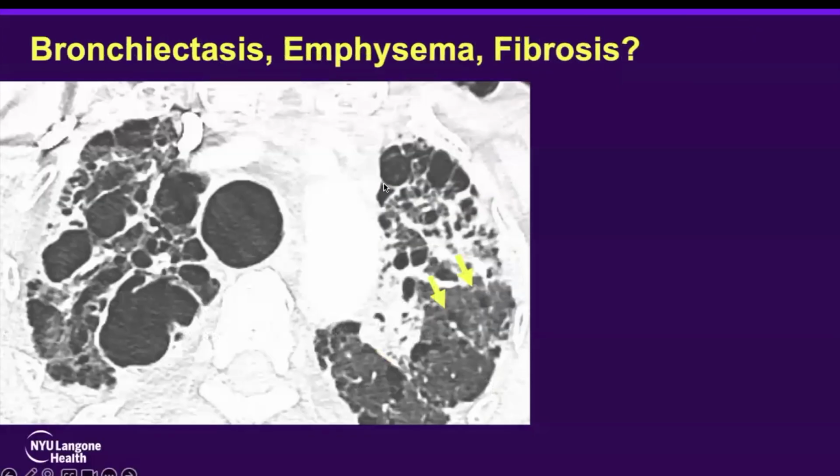Now, this case is encountered oftentimes when individuals show up acutely ill, and this patient lacked any prior imaging. Notice how there are large cystic abnormalities, and we need to consider whether this is truly cystic disease or is this emphysema that's surrounded by abnormality. And here you can see there is a good amount of consolidation, so it should bring up the fact that perhaps this could be emphysema that's surrounded by inflammation that makes the walls of the emphysema seem much more perceptible.